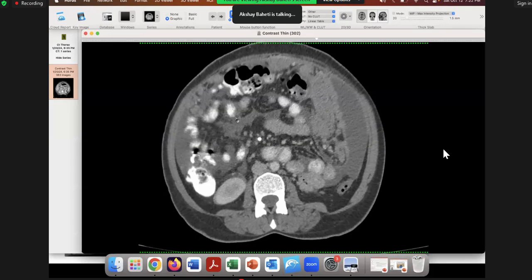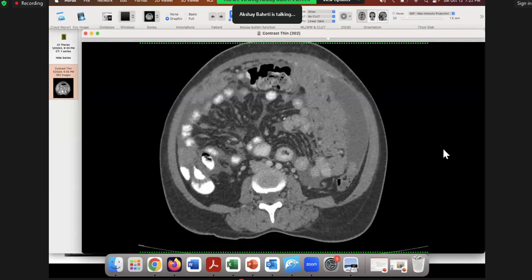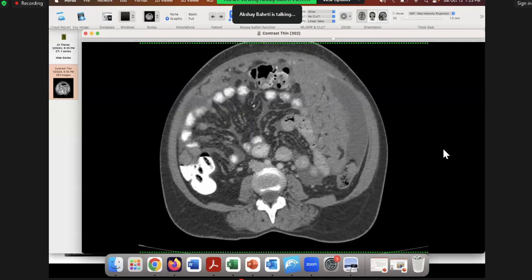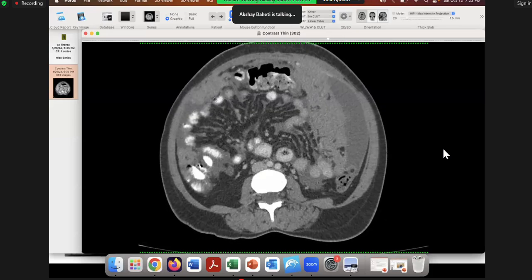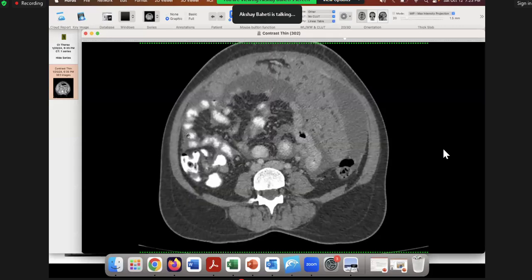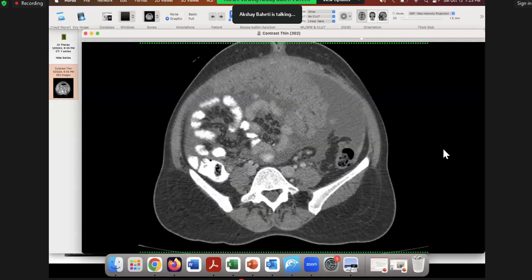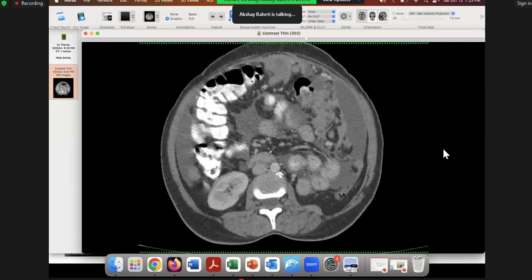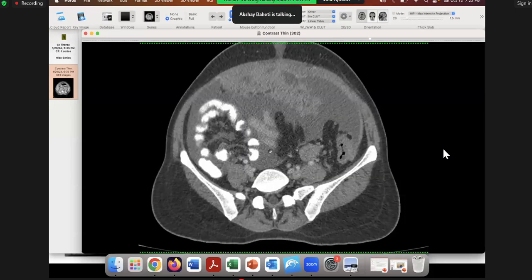Now what you see here are all sleeves of mesentery or leaves of mesentery. I'm sure when you have done dissection or you have seen a surgery, you have seen a lot of mesenteric leaves or sleeves just hanging around. They all arise from the root. So if the root is involved, you have to dissect the entire thing from duodenum till ileum. Not possible. But if there is a focal involvement of mesentery, yes, you can do it.